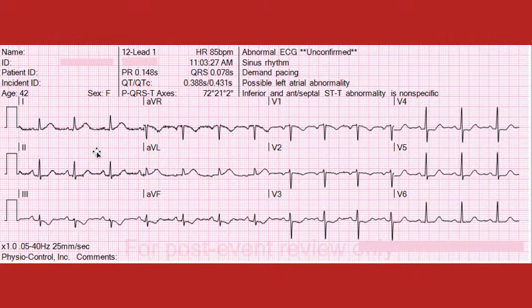Now let's go back to this idea of broad ST segment depression. Does it still fit a specific focal example, or is this consistent with generic subendocardial ischemia? Well, it seems to me that here in V3 we have a continued display of not only ST segment depression but dramatic ST segment sloping. You don't really appreciate that here in V5.